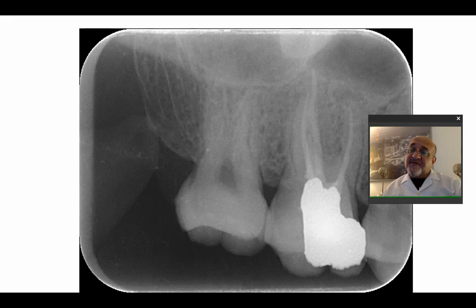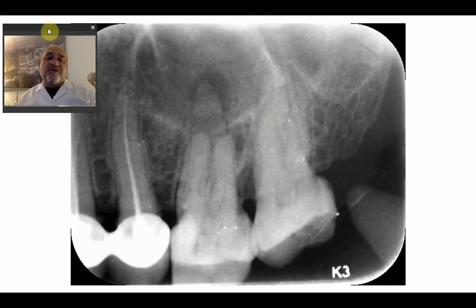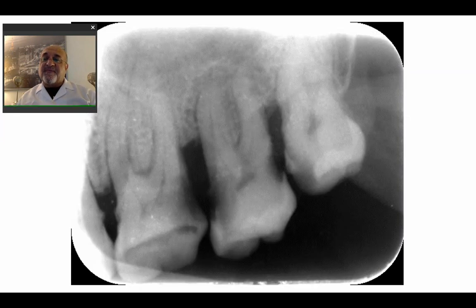The shape and the position varies from one subject to another. This is not necessarily a patient, it just differs anatomically from one person to another. Another radiograph where you can see the floor of maxillary sinus, maxillary tuberosity, and see this triangular piece. This is again the zygomatic process. This is the coronoid process of the mandible, which shows here because it is in the way. Another one.